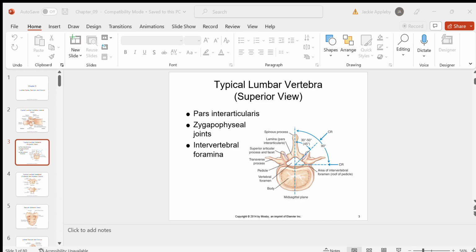All right. So this is our anterior of the patient. This is our posterior. Imagine for a moment that the patient was put into the PA projection, like is shown here. The patient is laying belly down on the table, and the central ray is coming from above. The patient's in the PA projection. You have to rotate this patient 45 degrees in order for that joint space to be pointing straight up towards the central ray. So, 45-degree rotation.